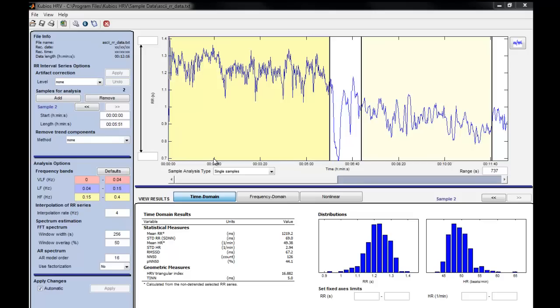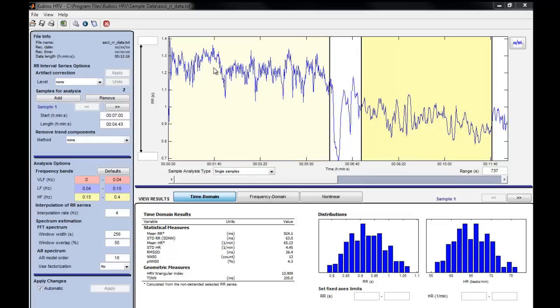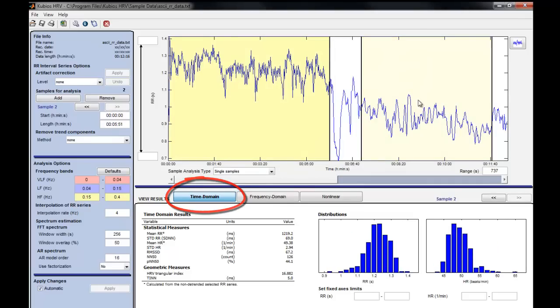Before we go on to the time domain analysis, I just want to point out this graph is in fact RR intervals, so the temporal distance or the time between any subsequent R waves, and is not in fact a graph of the heart rate itself. We're talking about variability, so we want to talk about the different distances between adjacent R waves. The first kind of analysis we're going to do is time domain analysis. Now, what does that let us do? It lets us study the temporal features of any different HRV wave, or RR interval, mean RR interval.